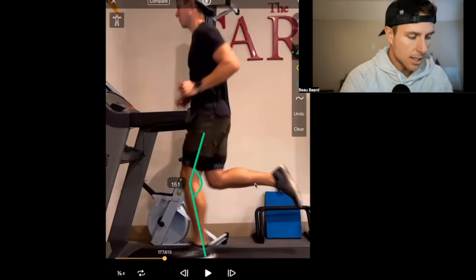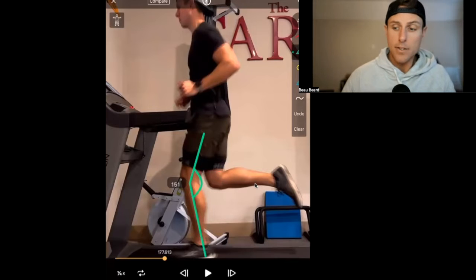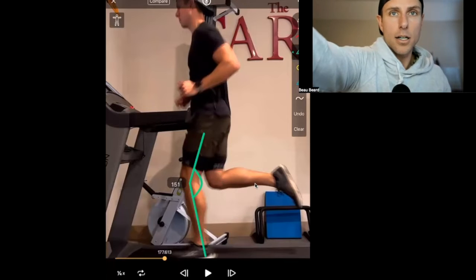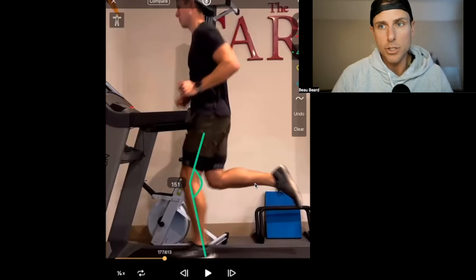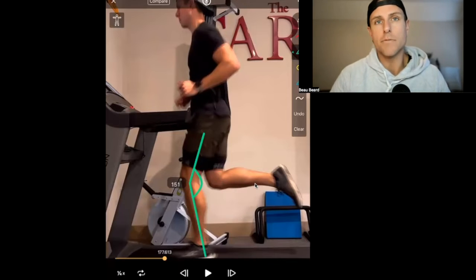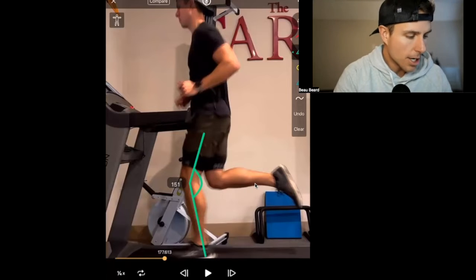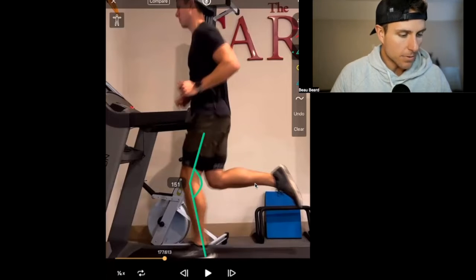When we see a knee flexion angle, you'll see elites will get upwards of 65 degrees of knee flexion at impact, which is metabolically costly on anterior thigh musculature, but it also reduces impact greatly. So over the duration of something like a marathon, it's a cost effectiveness equation of metabolics versus impact on the system, which you still have to deal with metabolically at some phase. So here we're at about 29 degrees of knee flexion. So I guess I'm not elite.